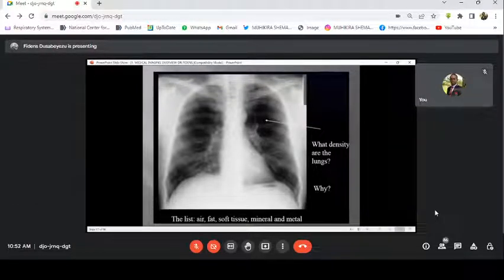What do you think happened? There was inspiration of air, a small quantity of air inside. No. Because in the lungs there is much air, a lot of air. Listen. X-rays have passed through it very easily and reached the film, and on the film it became dark.